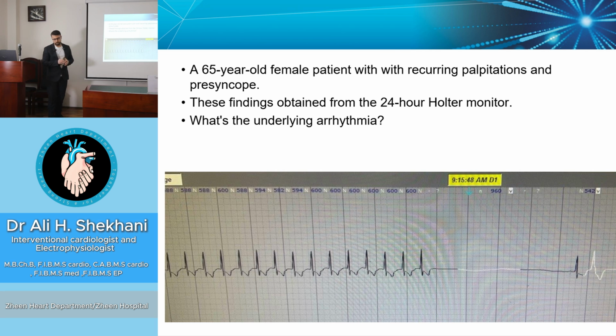And of course, regarding the indication for pacemaker in such a patient, if the patient is symptomatic, pauses of more than 3 seconds are important. However, in an asymptomatic patient, pauses of more than 5 or 6 seconds are important. So this patient is symptomatic and has a very long pause, more than 3 seconds. So the patient has an indication for pacemaker.